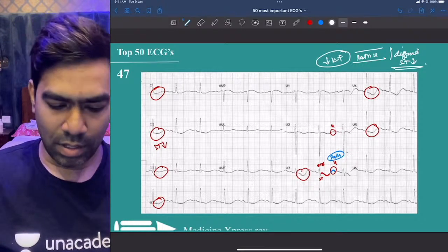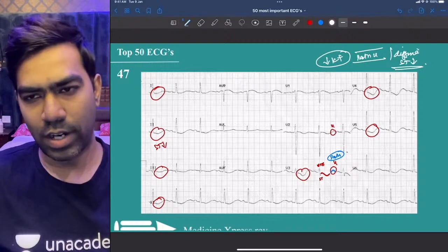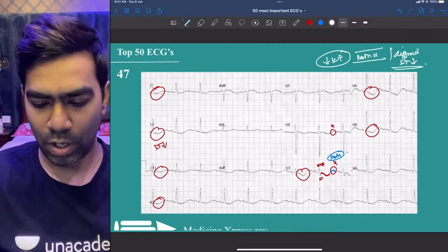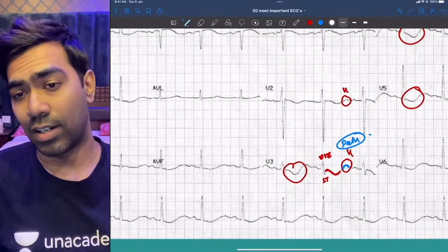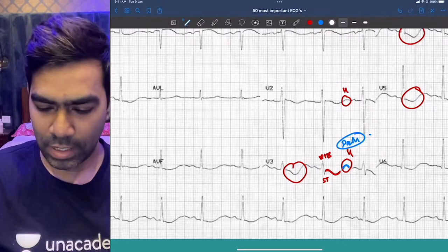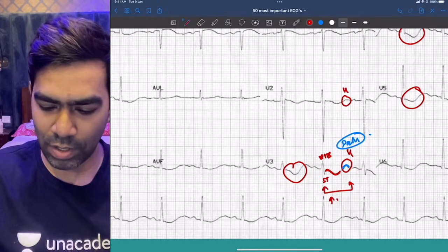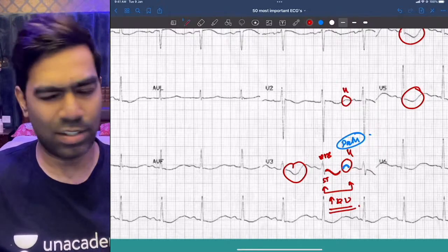And Karthik is talking about prolonged QT. Yes, that's correct. At an undergrad level, you can call it a prolonged QT. Not a problem at all. But to be honest, according to most researchers, it's not the prolonged QT in hypokalemia. It's the prolonged QU that happens. The QU interval is the one that will be prolonged in hypokalemia. Actually, it's not the QT interval.